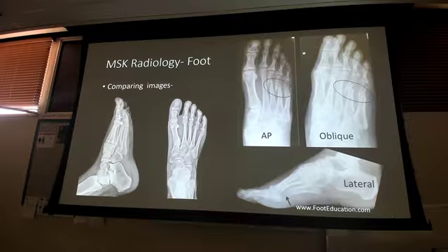This lateral is showing you, this actually works out for this lateral, because I'm missing something there. Can you see what we're missing? Yeah, bone. This is going to be some of that osteomyelitis that came from a diabetic ulcer, right? Got in here, started eating away at that bone. That's what the lateral is showing on that one. Different than the regular fractures of the AP oblique.